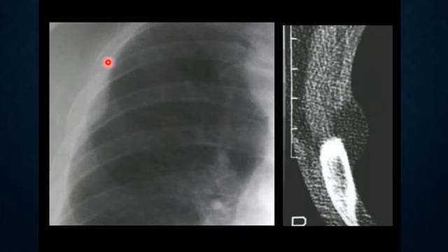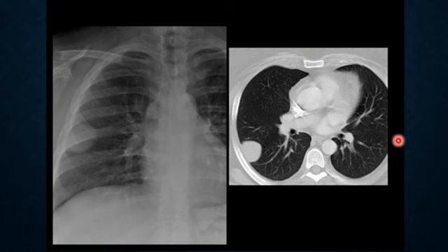Again, this is a mass here. The angle here is wide. So is it over or under the rug? Under the rug. Okay? It is not from the lung. It is from the pleura or extrapleural. Another example. Where is the origin of this mass?